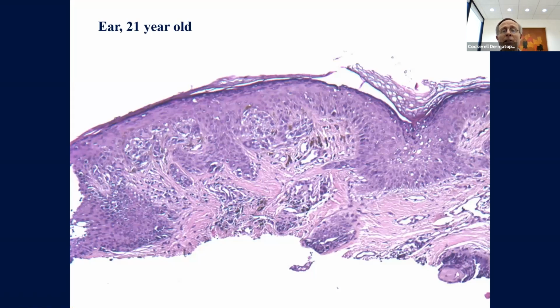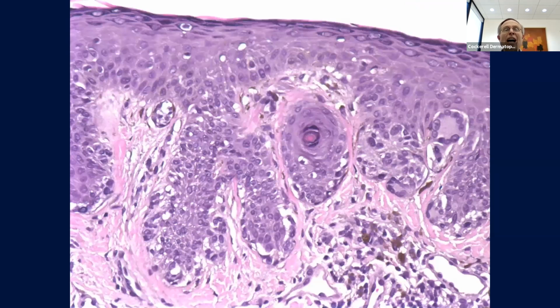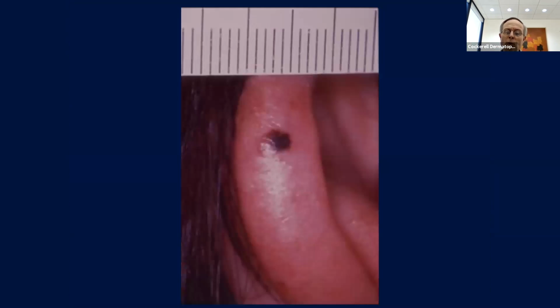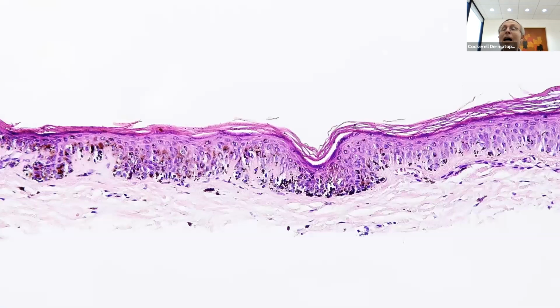So again, they look like nevi. When you biopsy them, they have this spitzoid character, epithelioid and spindle-shaped cells to them. So this is, gosh, we see this probably a couple, 3 times a day in our laboratory. So it's a real common phenomenon. This is not a melanoma. It's a totally benign process. It's got the spitzoid morphology. So those are just some examples of special site nevi that are not malignant melanoma.